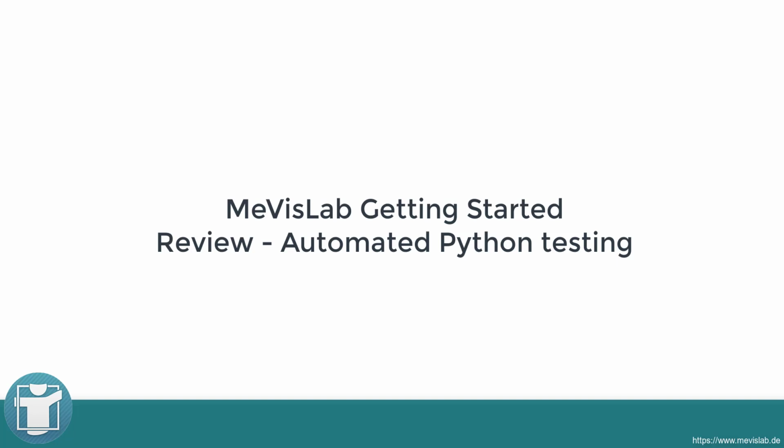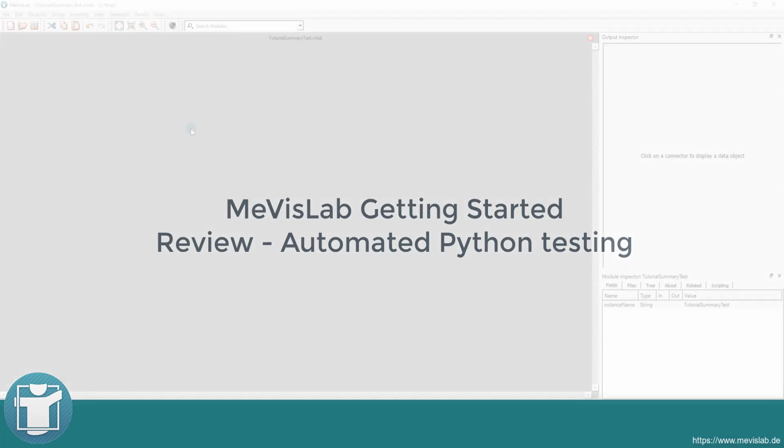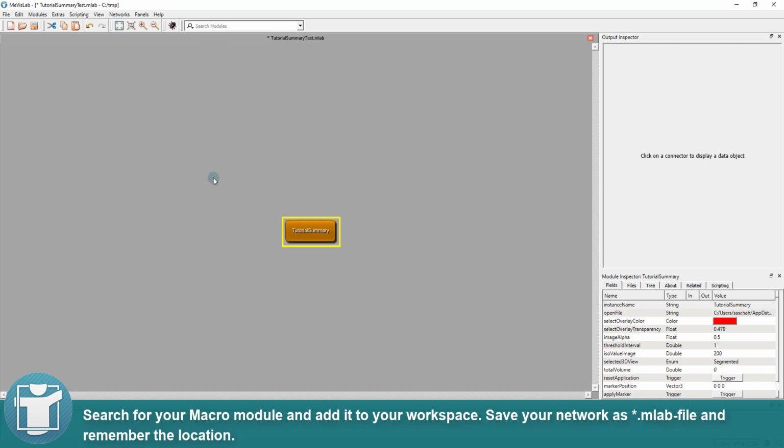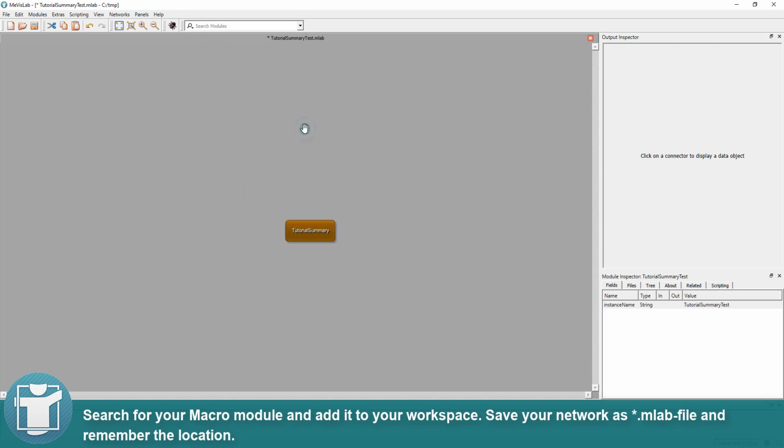In this video, we write an automated Python test for our macro module. Search for your macro module and add it to your workspace. Save your network as MLab file and remember the location.